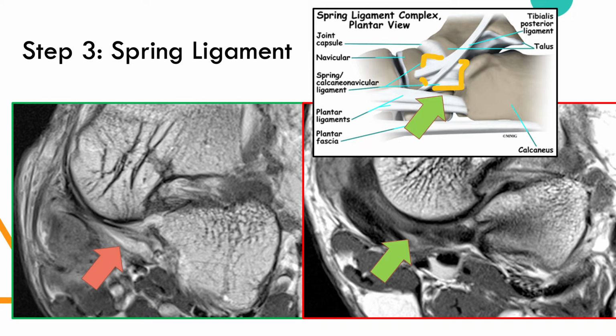Now, obviously, you can see that this is a subtle call to make. It's not something that's easily made, and oftentimes requires a clinical correlation of somebody having anteromedial pain in those regions.